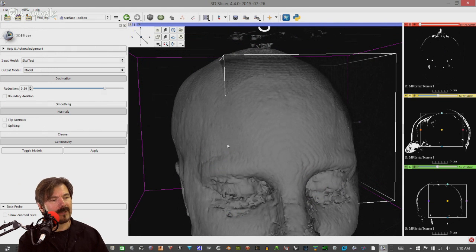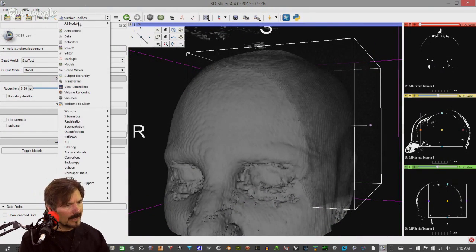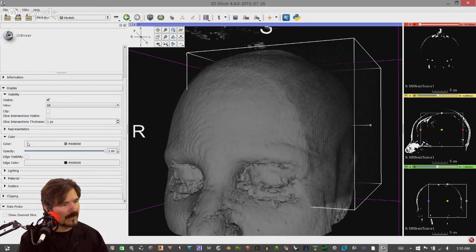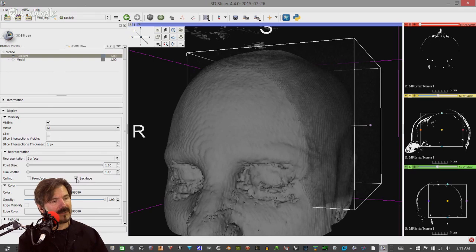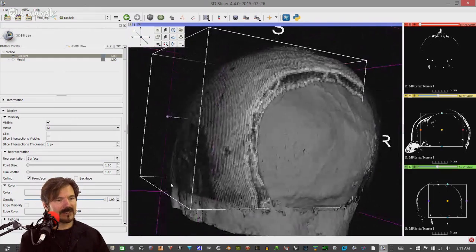And one of the things that I had issues with that you can't see here, even though this is a three-dimensional model, is that, let's go back to our models. If you're familiar with 3D, there's actually two sides of a surface. Normally you show either the front or the rear. But if you're looking at it from the rear and you don't have the normals turned on, you don't see it. It's invisible. So this gives you the ability, and what was happening to me when I was creating a 3D model to look at is, yeah, here we go. I'll turn that off. I wasn't able to see, but there. So I've just turned off the front.